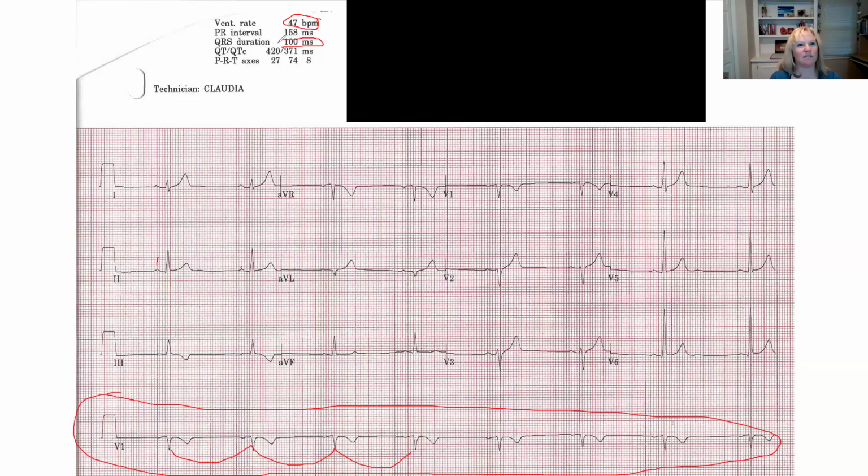It's starting to get a little closer to 120, which I'm not liking, because at 120, we start to worry about the bundles. We talked about that, but this is a sinus Brady. So let's talk about this for a second, okay?